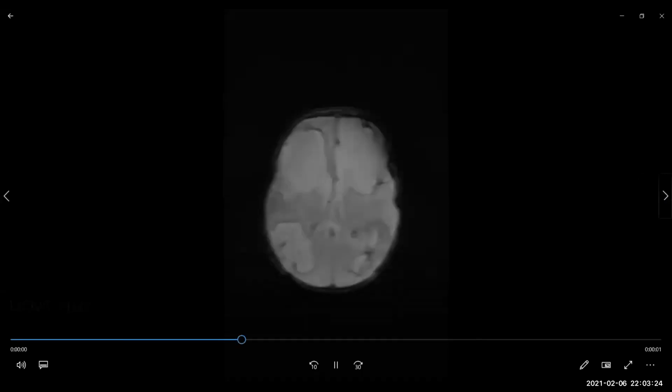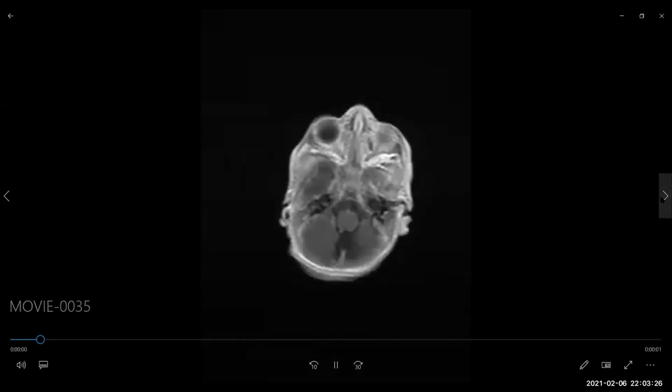So here you can see the ventricles as well. I think so. I would like to see the angiogram if available. Sorry, no angiogram available. So I'm thinking the possibility of an acute vascular insult causing this infarct, and maybe ischemic necrosis or coagulative necrosis is my differential. So I would like to ask for any hypoxia.